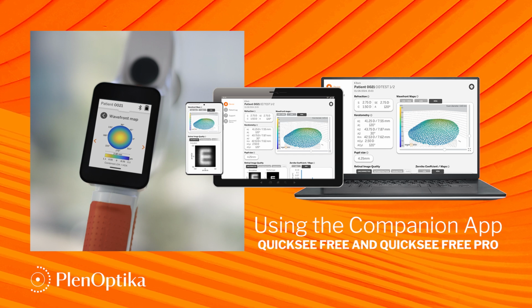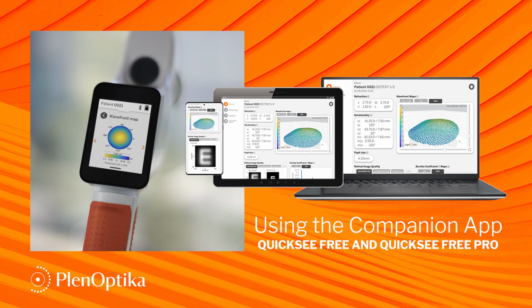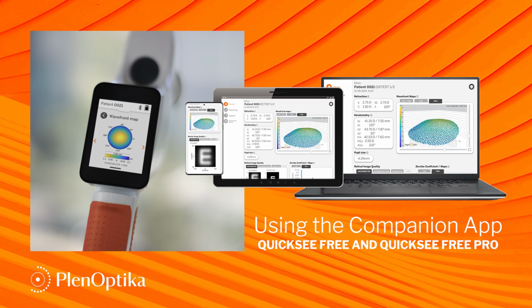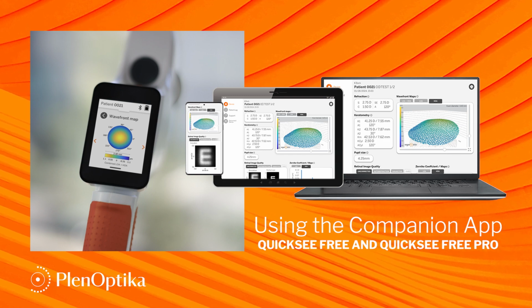Together with this update, the updated QuickSee Free companion app version 2 has been launched, maximizing the potential of these new capabilities. One of the standout features of this update is the introduction of detailed results, which offer deeper insights into the patient's refraction by incorporating the calculation of high-order Zernike coefficients. Let's take a closer look at these features.